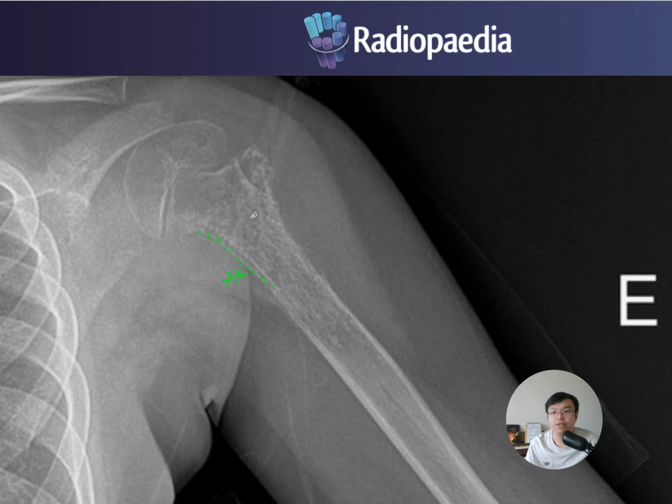is that Ewing sarcoma is more permeative, more infiltrative. Usually they will not have very big bone erosion, but they will try to invaginate through tiny holes of the cortex. So they will have a very sizable extraosseous soft tissue component without a very significant bony destruction of the parent bone. For such a broad extraosseous soft tissue component, you expect to see a broader layering of periosteal reaction, which looks like this, which is more classic.